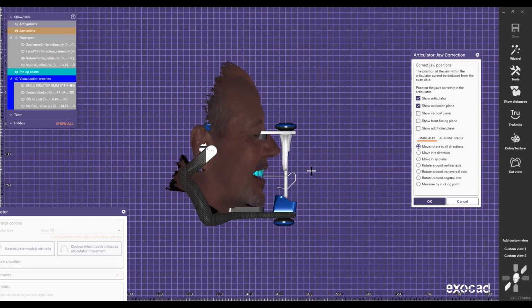It's when we go to the restroom, right, and we see our faces in the mirror, we always put our face straight. So that's basically the position that we're looking for here. And I can see a nice imaginary angle right here from the chin to the nose and the nose to the forehead. And that's what I'm looking for here.